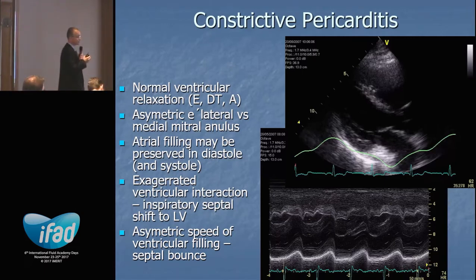But there is, again, the ventricular interaction, which is exaggerated, and the septal bounce can be seen on the M-mode here as this notch, which protrudes more and more here with the inspiration on the septum towards the left ventricle, and then it becomes less again with the expiration, so the inspiration, expiration.